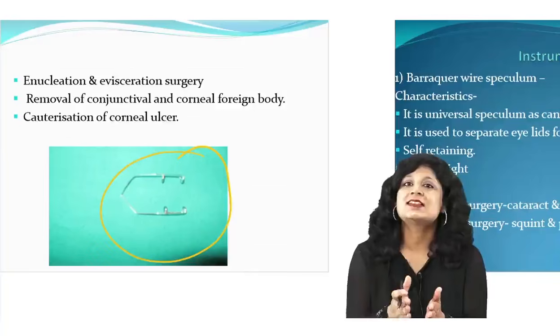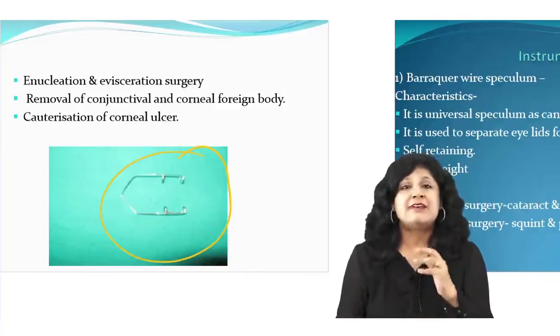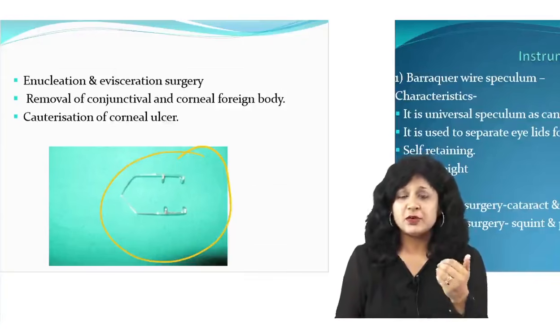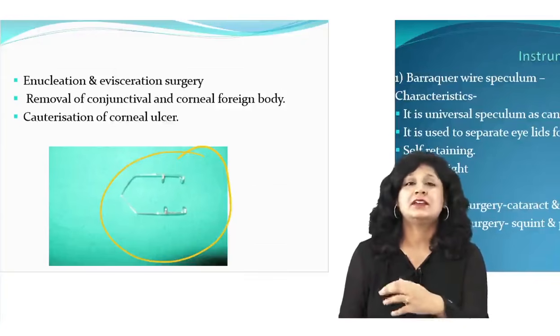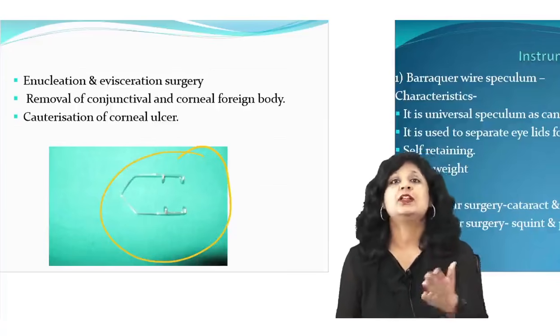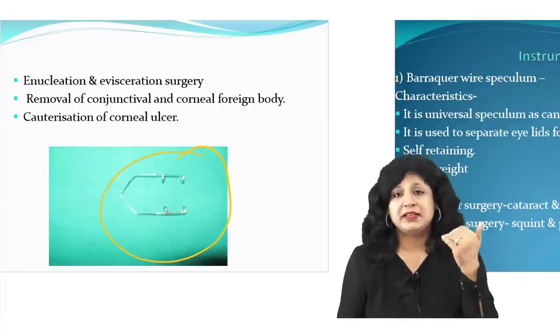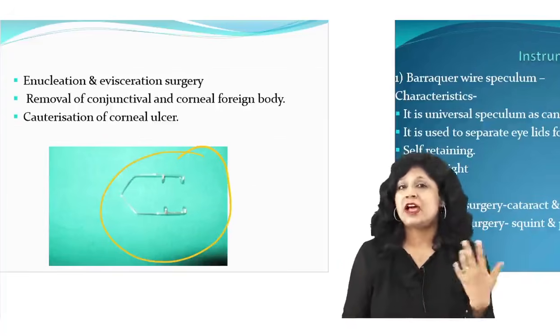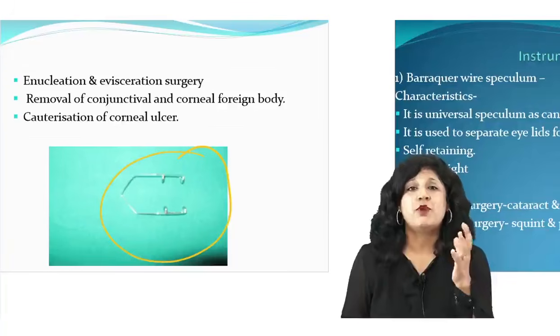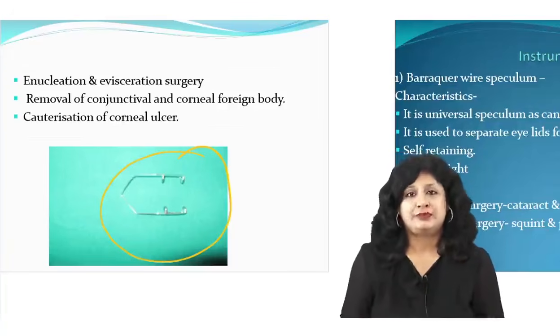And I think this is one of the very common uses of the speculum, because every day when you are there in the OPD, there must be some patients, and everybody who is posted in the OPDs, or who has already passed or maybe is doing the internship posting in ophthalmology, will agree with me that foreign body is a very common case that you get in the ophthal OPDs.